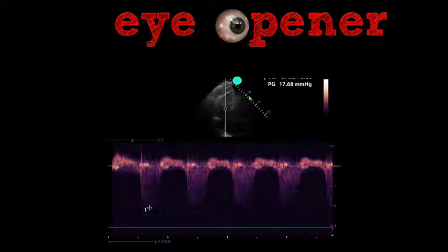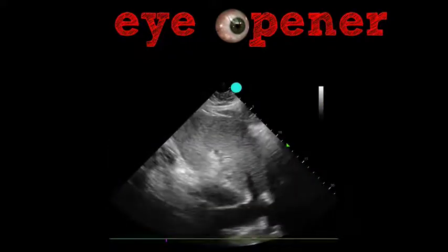I was expecting, with a dilated right ventricle that doesn't appear to be squeezing well, the pressures to be pretty high, but in this case, a pressure of about 18 millimeters of mercury. Even if we add a relatively high central venous pressure of 15 millimeters of mercury, still gets us barely into mild pulmonary hypertension range. So that was a little bit surprising.